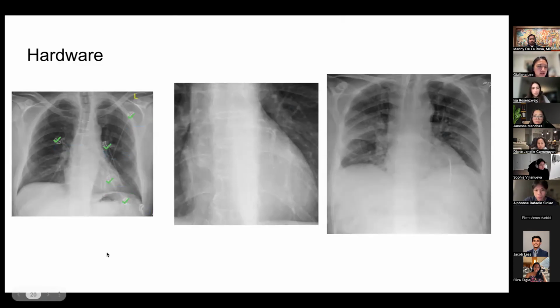But also something that you might see on a patient are these wires right here. Does anybody know what that might be? Has anyone seen that on the wards? Sternal wires. Yes, sternal wires, open heart. Exactly. So for folks who ever had an open heart surgery, they had to have a sternotomy where they opened up the chest wall. Those live in a person forever after that. I feel like in older patients, I see that pretty often.